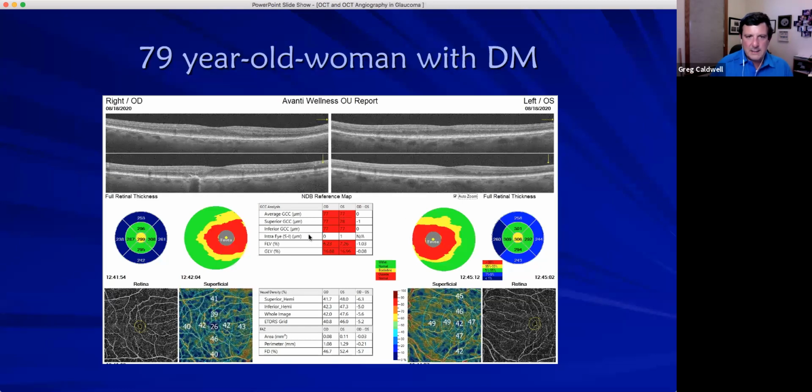When it's symmetric out there, again, I can get burnt one of these days, but most likely if it's symmetric, it's most likely not going to be disease. So that kind of tees it up. So let's look at some glaucoma patients.